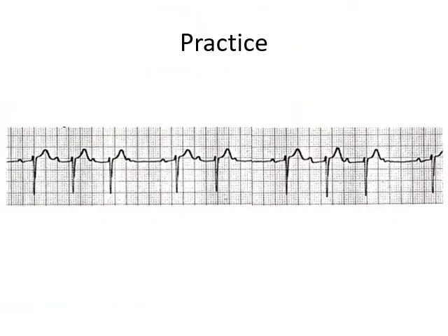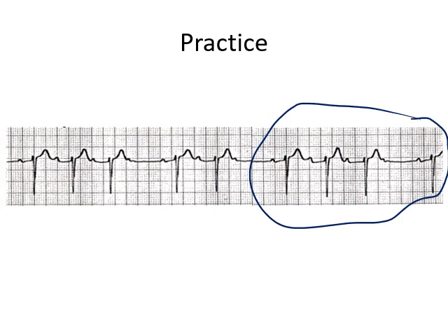Let's practice one more ECG. I'll take a 1 second pause for you guys to interpret this. Alright, I want you guys to focus on these beats on this ECG. Now let's start marking the PR intervals. Number one, in first beat PR interval is this. In second beat PR interval is this. In third beat PR interval is this. And in fourth beat, however, we see only P wave and it is not followed by a QRS complex. So there is progressive prolongation of PR interval and a missed beat.